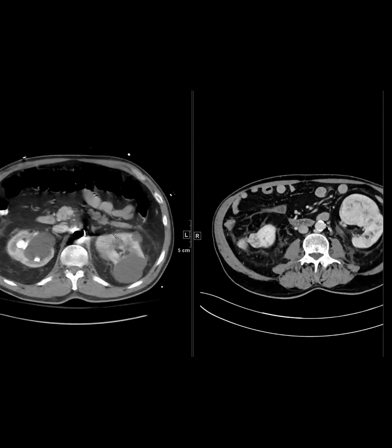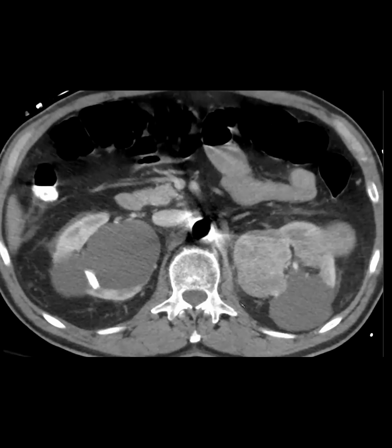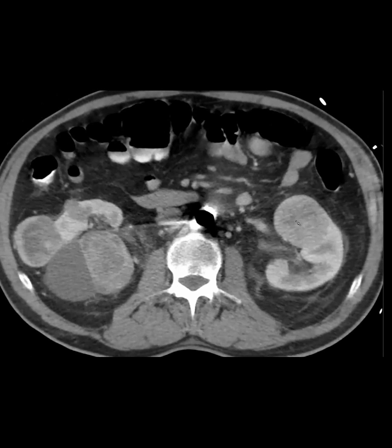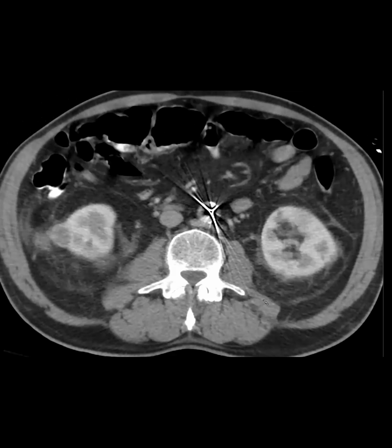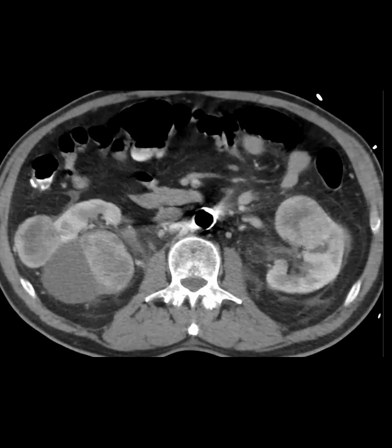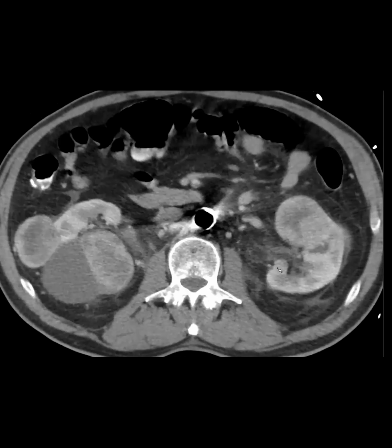Yep. Okay. This was an interesting case. So this is a patient 5 years ago, and you can see they've got renal cysts, but they also have renal masses. So here's one. They have bilateral, fairly solid appearing renal masses, some of which have central necrosis or central scar. Was the patient VHL?